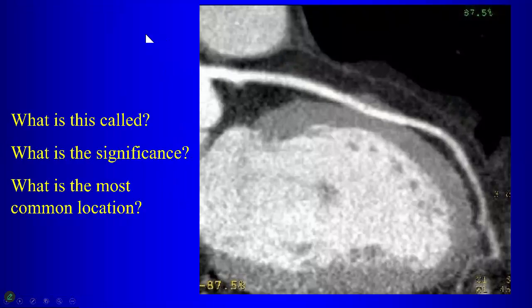Okay. So let's talk about some coronary anomalies. So what vessel are we looking at here? LAD. Yeah, so we're looking at the LAD, okay? And what do we have? Myocardial bridge. Okay, so this is a myocardial bridge. How did you identify that as a bridge? Goes within the muscular. Yes, so it dives down into the myocardium, right? So it's going into the myocardium.